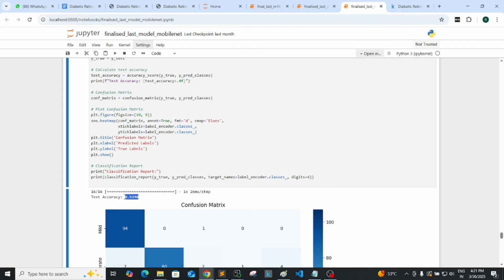When you take our training models, the training accuracies are all more than 98, almost 99. Actually, some papers will present only the training accuracy as the accuracy. Sometimes they won't mention the testing and validation accuracies. You should keep that in mind and be very careful. You should present training, testing and validation, all three, in the papers or the presentation.